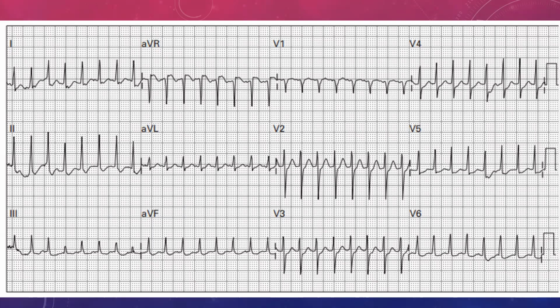Okay. Now, these are the fundamentals of a supraventricular tachycardia. Number one, it's generally above 150 beats per minute. Number two, you can't really see P waves. So you can't talk about PR intervals and making sure the QRS, or in other words the ventricle, is always contracting after the atrium. But the QRS complexes are narrow, so we know that the ventricle is being stimulated by the atrium. But the difference is that it's absolutely regular.